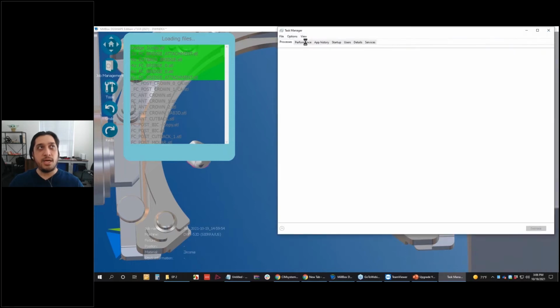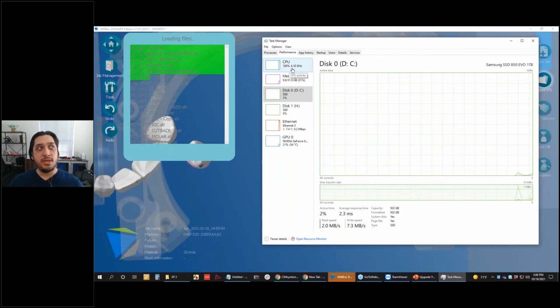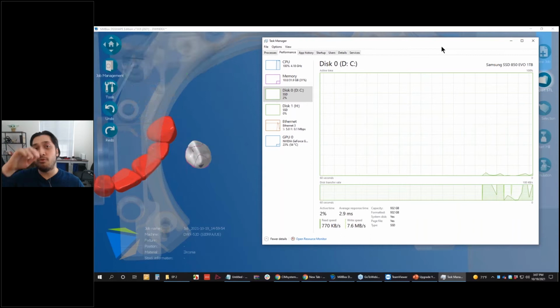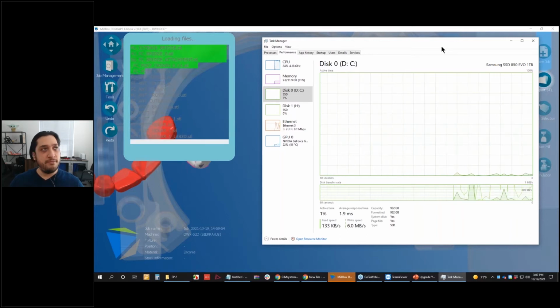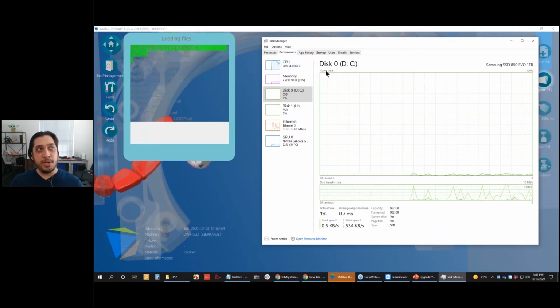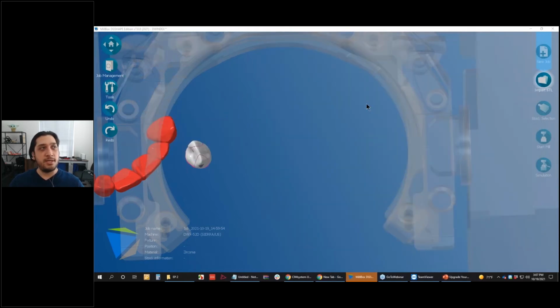And this is where MillBox and the improvements that we've made over time really scale, because you can see it's using all of my computer's resources to pull in all of those files, which is really great. Also, some of what we did improvement-wise to this feature was we made it to where you could queue up, I think we process now up to 13 files or something like that at the same time. So it just kind of depends on your computer's performance and your rig and whether or not your processor can handle it. But as you can see, my computer's kind of struggling here at a couple of them. So it really depends on the spec of the processor, I would say, and what affects that.